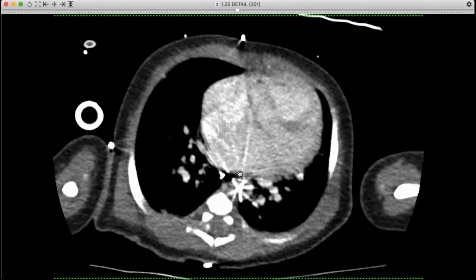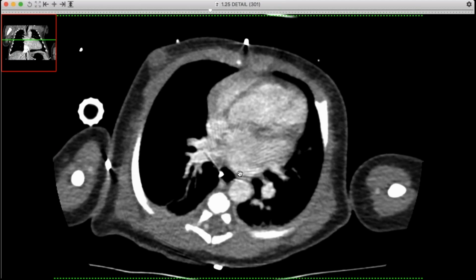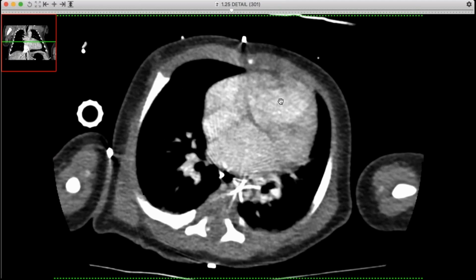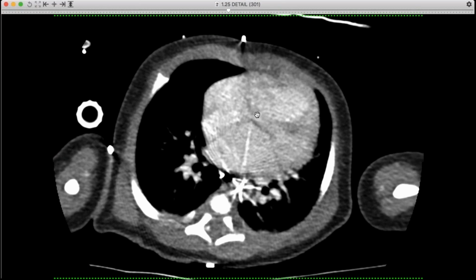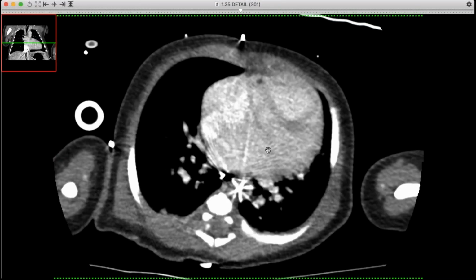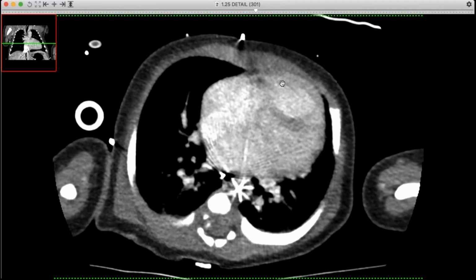Wow. Yeah. So this common vessel comes off more from the right ventricle, or? It's usually an overriding aorta. If we look at the contrast mix, in this case, it looks like it's more coming off the right, because the septum's down in here. But there should be a shunt, a VSD, or an overriding aorta to allow the left ventricle to empty. But you can see the right heart's quite dilated compared to the left.